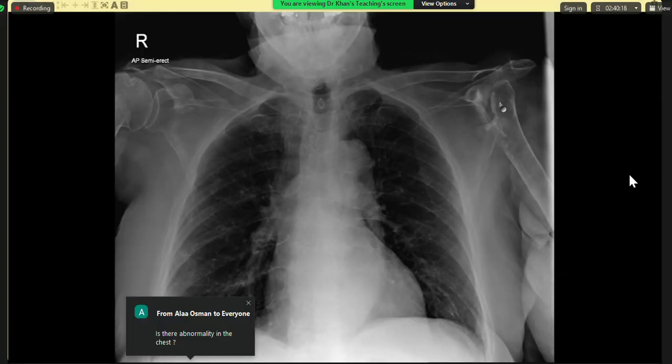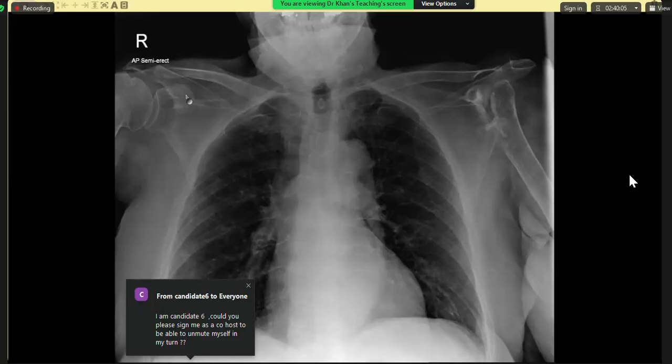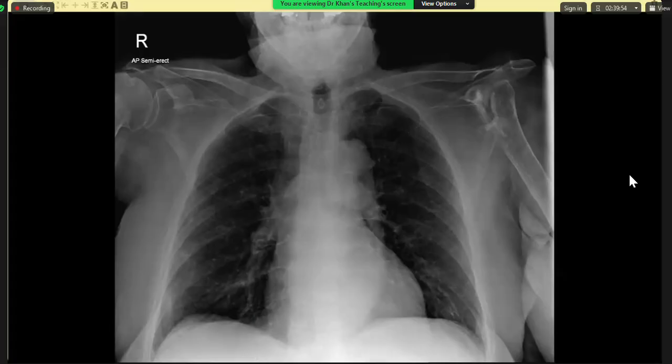As far as chest is concerned, there were some incidental findings, but I am not interested in anything in the chest in this case. Okay, well done. Your thought process was good, except that rheumatoid arthritis, you ruled out rheumatoid arthritis for reasons which, just one second.